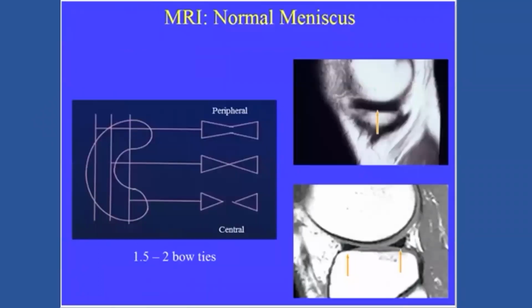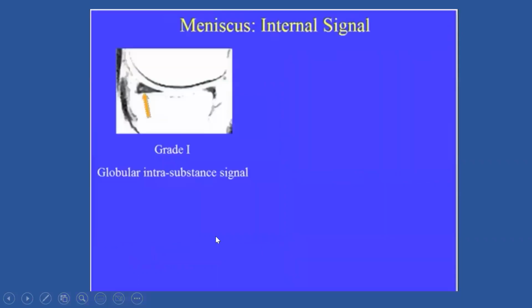If you look at the meniscus and you take cuts of them, you see the cut on the outer edge is as is, then you know there is wedging inside. The cut becomes more oblique and then it becomes discontinuous. These are the cuts we see on sagittal views. This is an intact meniscus. This is an intact meniscus, but with a globular intrasubstance signal.